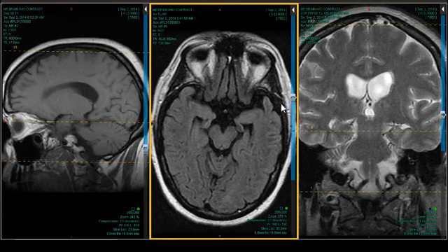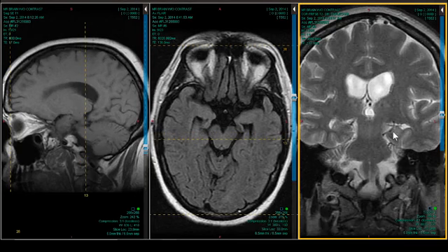Yeah, and as I was looking at it on the fly, while there is some entorhinal cortex atrophy, it's not overwhelming. When you see an ALZ case, this thing is reduced to the size of a pea. So I was doing a little dancing and hedging there, but as soon as I saw this, I started to change my mind.